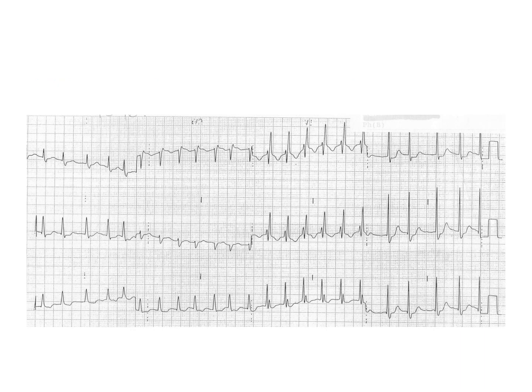Let's look at this one. So lead 1 is mostly positive, so electricity still seems to be going towards the left. 2 strongly positive, AVL is negative, so it's going downwards, and then leads AVF and 3 are strongly positive and quite similar in amplitude, so it looks like electricity is going almost straight down, just slightly deviated towards the left, so still left dominant, but a little bit more rightwards than is usual.